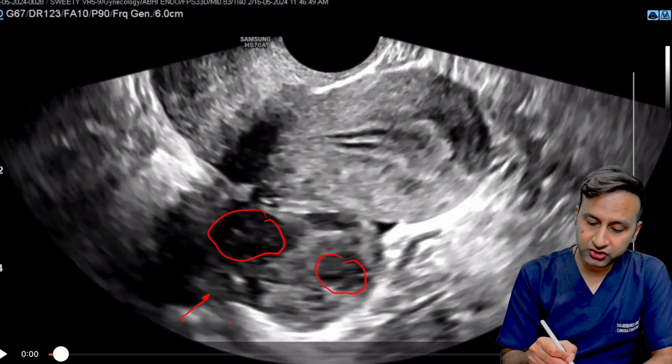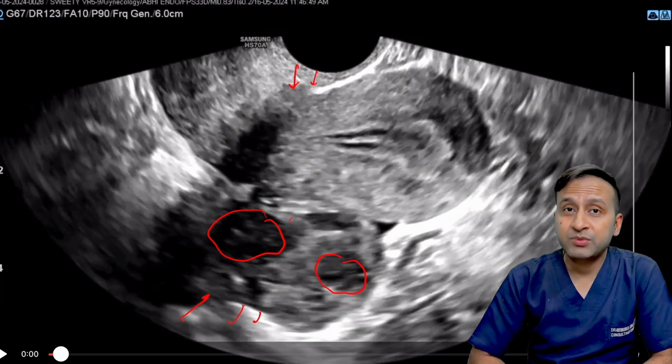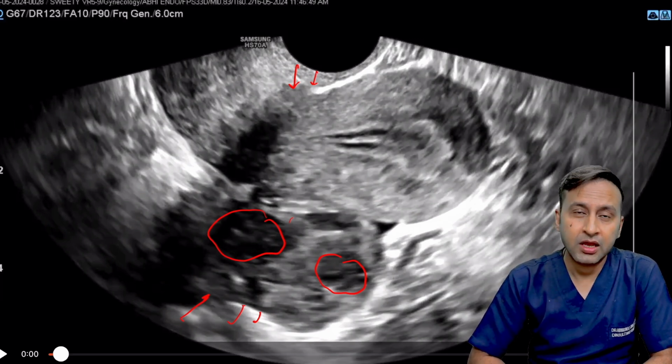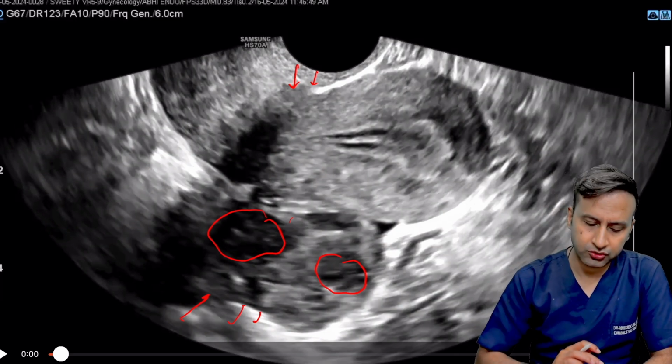Then, if you see the position of this ovary, where is it located? It is located just posterior to the uterus. It means it is located in the pouch of Douglas. Another very important clue to the presence of endometriosis and adhesions. The ovaries would be seen free in the adnexal regions, but if you see them very close to the uterus or in the pouch of Douglas, in presence of a history of dysmenorrhea, think about endometriosis.